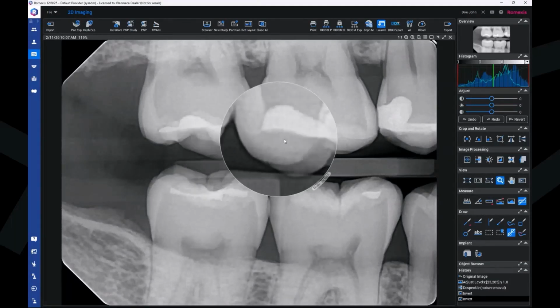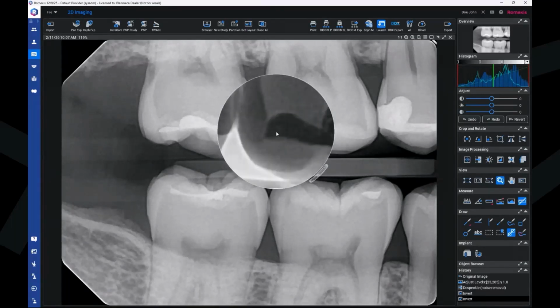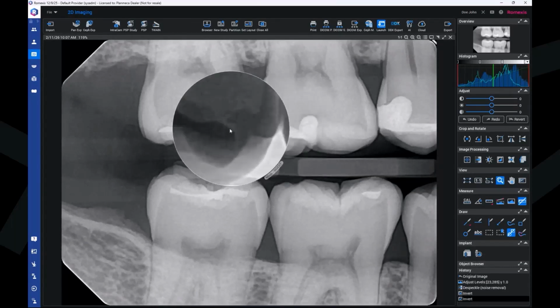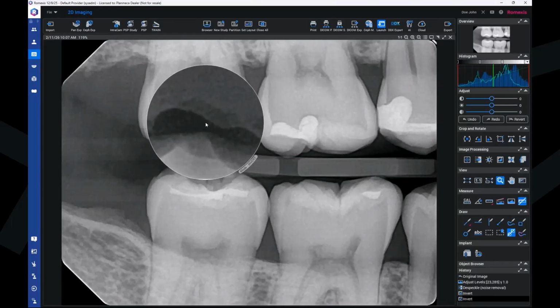And this magnifier actually also has other possibilities. So if you click with the mouse right button, it will add a filter to the magnification. So this is now the inversion. It says again there around the circle, mode invert.